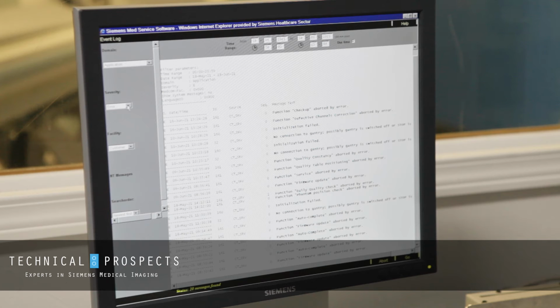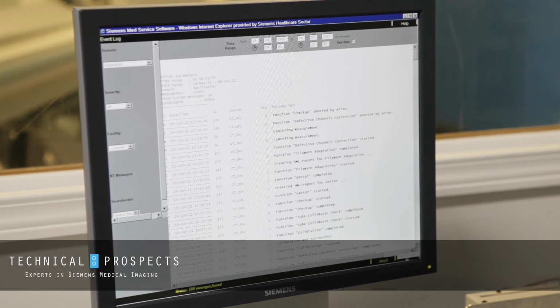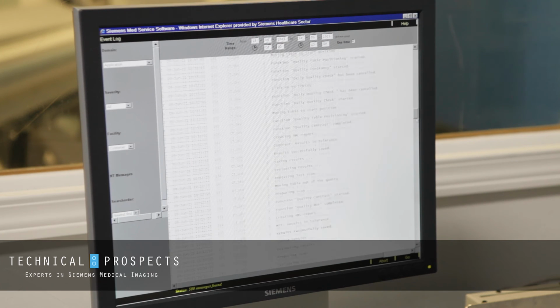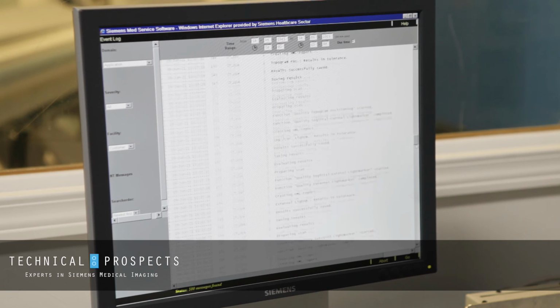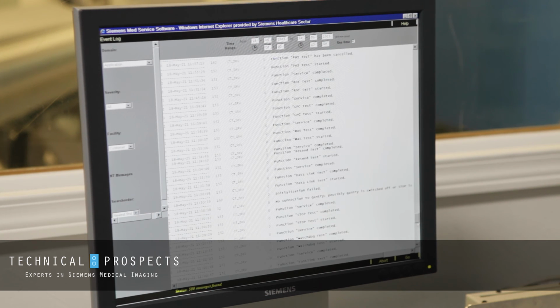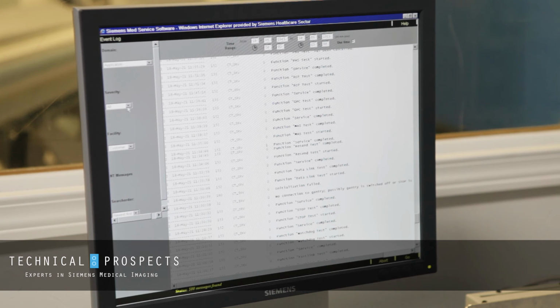You can go to severity, select warning as well, or all, or information. Let's select all this time. And we'll click Go. Now, of course, we'll have more items populated here. So we'll scroll down. So all events that had an issue or an error or warning or even information at this point, because we selected all for our severity level, we'll have all events here now.